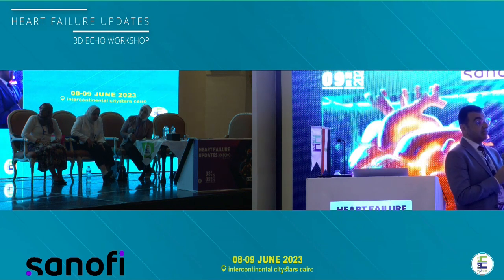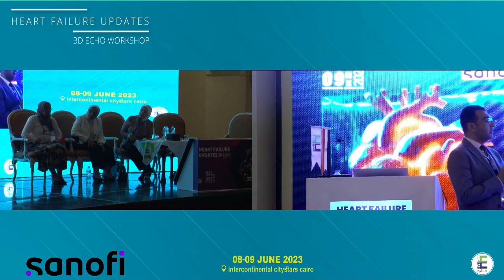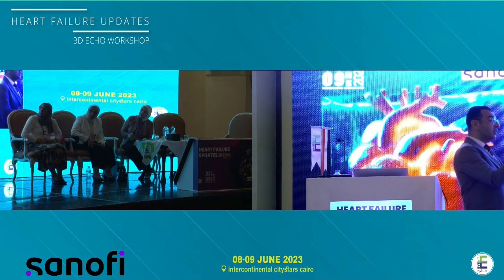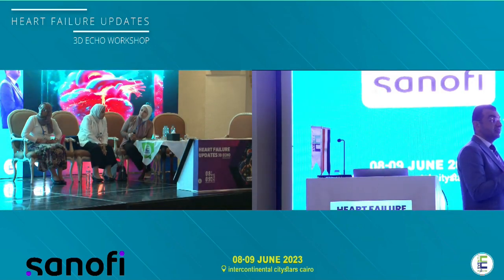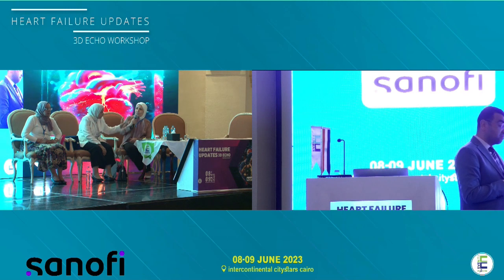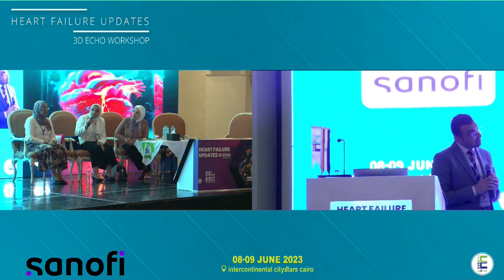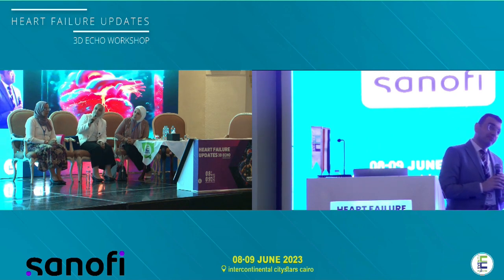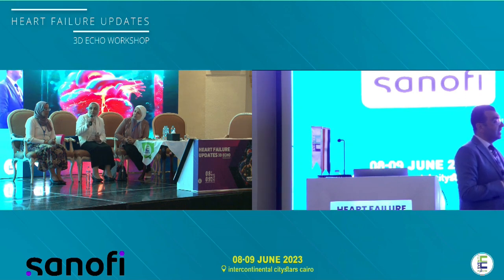So this is the size. About the rims, you can have a single full volume or 3D zoom image, and you take all the measurements in a very clear way, and also the interatrial septal redundancy, whether it reaches the roof or not, the 3D helps you a lot in determining that. Plus, you didn't mention the balloon sizing, which is an important step, especially in the redundant septum. Yes, the 3D will help a lot with this. Thank you very much.